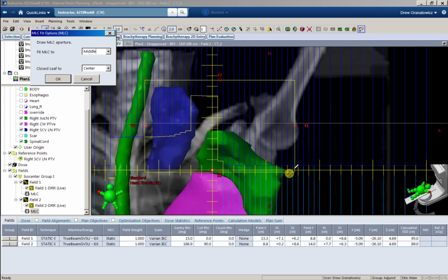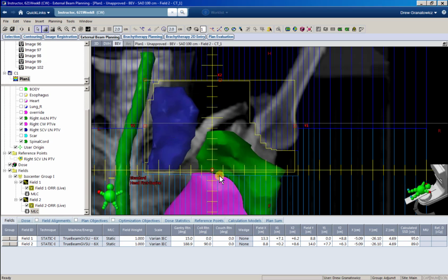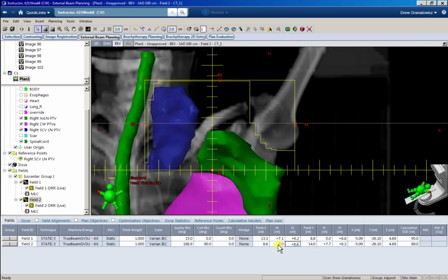on the anterior side. I'm going to block this humeral head, come straight up. We're going to follow the edge of this superclav. That comes slightly below this bottom jaw again. Now this bottom jaw is X1, so I'm going to come in here, and in X1 I'm going to make sure I type 0, so it's perfectly flat again.